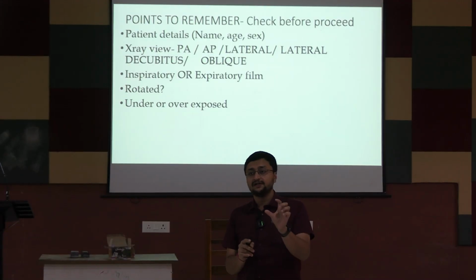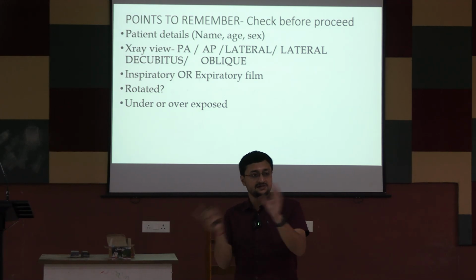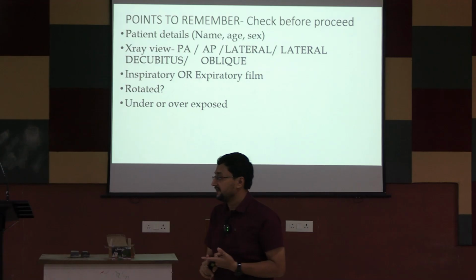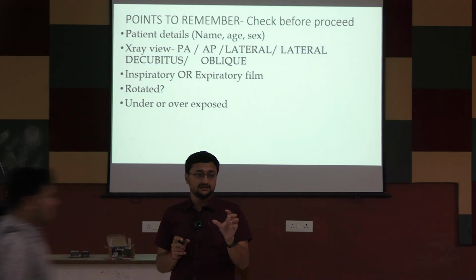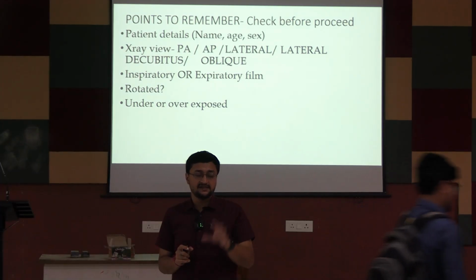And the name of the, so you may be looking at a chest X-ray of some other patient, you didn't notice, the next patient's X-ray was given to you, right? So very important thing is, first you have to check the details of the patient that are written in the chest X-ray, whether the name is right, whether the age and sex are right.